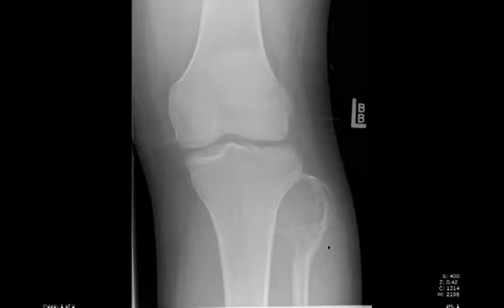Another view of the knee, geographic expansile lytic lesion involving the epiphysis of the proximal fibula, narrow zone of transition. This one is centrally located because really there's nothing left of the bone except the tumor, so you can see it's centrally located. This one turned out to be another giant cell tumor. I think an aneurysmal bone cyst would be a reasonable differential to consider in this case.